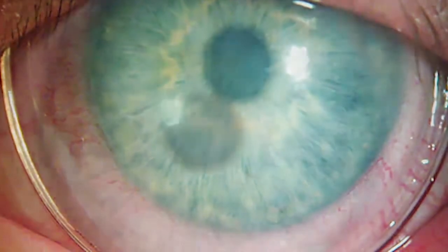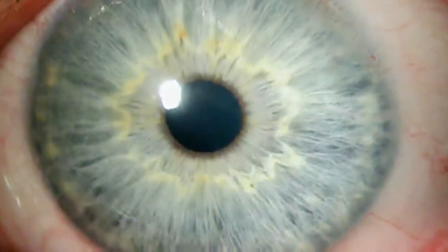She attained full 100% reepithelialization without any subepithelial haze or scar tissue, and we were able to achieve accurate enough biometry. As you can see from the post-treatment placido disc images, the biometry was much more accurate, and rather than giving her the multifocal lens implant that she desired, we were actually able to place a presbyopic correcting implant, an accommodating lens that met her needs, and she came away very, very satisfied, as much as her surgeon was.